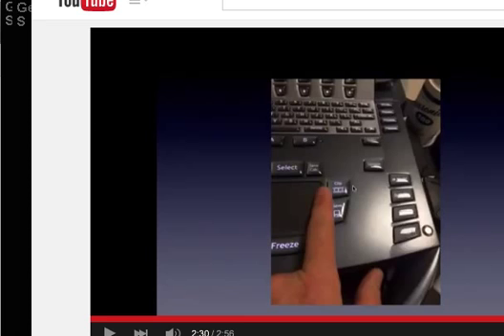One thing is that most of the images that were saved were stills and not clips, and so this is our Sonosite machine here, and you can see this button here that says clip. You pressed, I think, the save button many times, and I think that's the cause of why you had most of the stills. You want to press the clip button right here and not the save button. So again, when you can, just so I can get videos as opposed to stills, press the clip and not the save. So hope this helps.